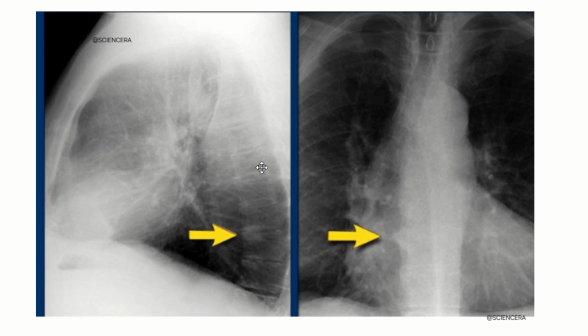Now this is the lateral view of the lungs. When the doctors look at the side view of the X-ray, the lateral view of the chest, they sometimes see something that looks like a mass in the lung. So this is pointed with a yellow arrow. They think that there is a mass in the lungs, but before jumping to the conclusion, they need to check if there is any unusual density around the bones of the spine, your vertebral bodies. This can happen if someone has a condition called spondylosis, which affects the bone and the disc of the spine.